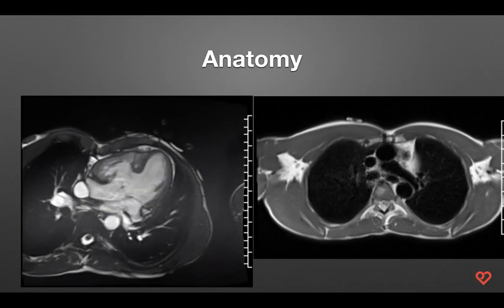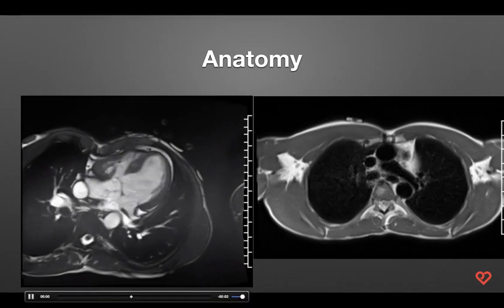When we look here, we have a right ventricle, a large VSD, the left ventricle. We have the mitral valve and the tricuspid valve. And you basically have two atria, but there's an atrial septal defect there. So this heart is functioning as a single ventricle. This is the descending aorta, and this will be the Fontan that will show up in the next picture.